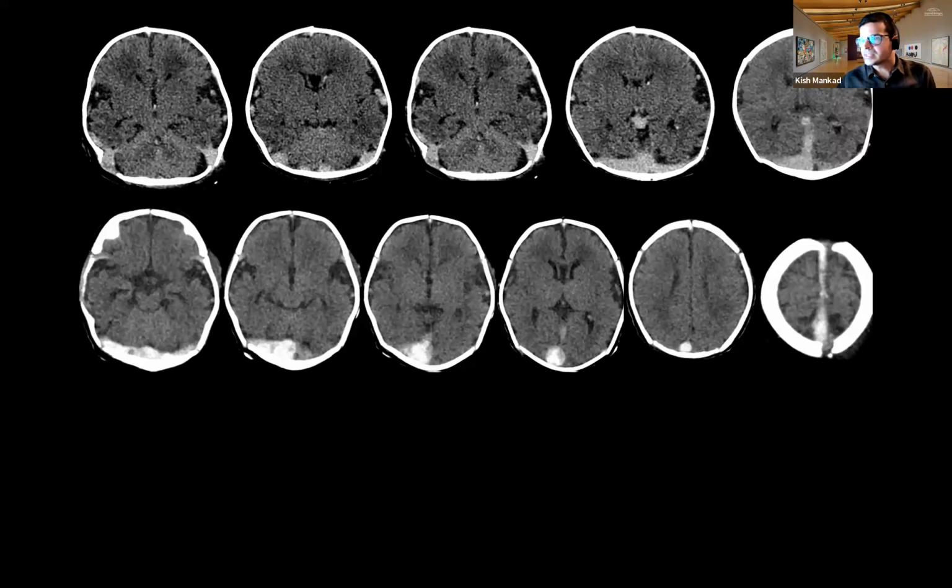So yeah, hyperdensity with expansion, and then the CT is done at day 9. The reason why nothing is done is because in neonates, and you can teach me better on this, with venous sinus thrombosis, unless and until they have an infarction in the brain or a large hemorrhagic clot associated with it, the treatment lies really with managing the sepsis and the hydration status of the child. But in this case, of course, the seizures continued. When they have seizures, there should be a low threshold to treat. This child was not treated, and remained refractory to any other form of medical treatment.